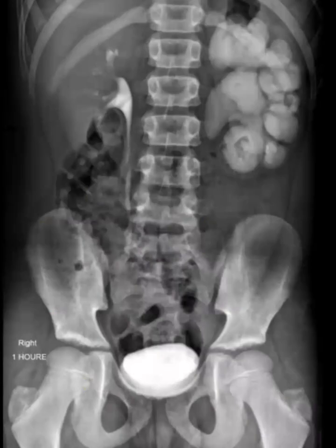Here is a dense calcification on the left side in the left kidney. Nephrocalcification maybe. You cannot comment on the calcification because we have given the contrast. So this is not calcification when you have given the contrast media. Actually, it is contrast accumulation in the left kidney.